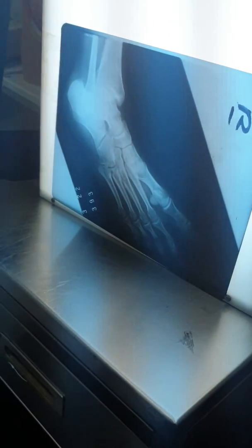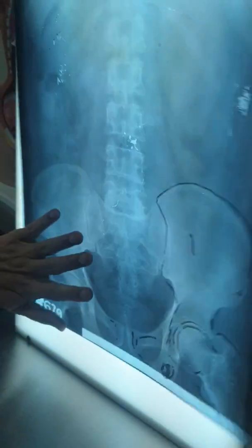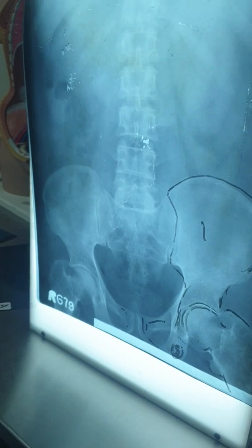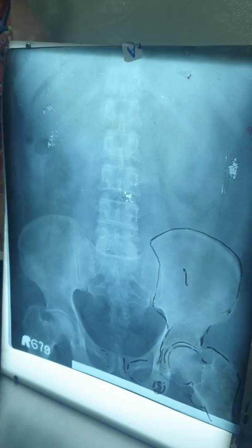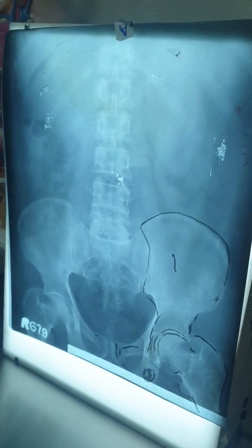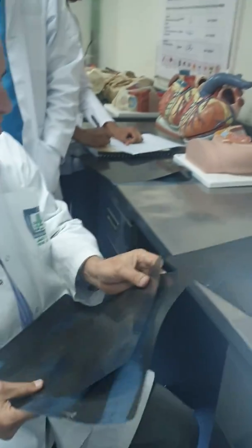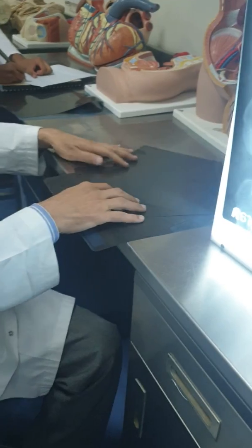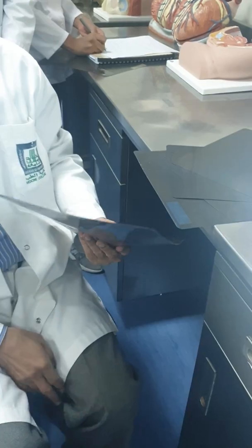So just revise these X-rays, starting from the first one. Then I show you these two, which are again important, and the identification of the bones. Just identify the bones here in the joint. I just leave it here. You can see these X-rays. I told you the type of questions which are usually asked. Remember Shenton's line.